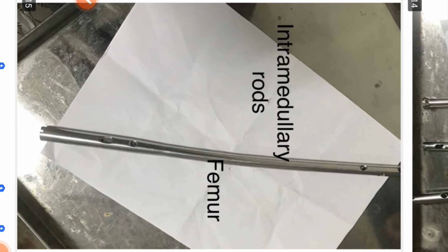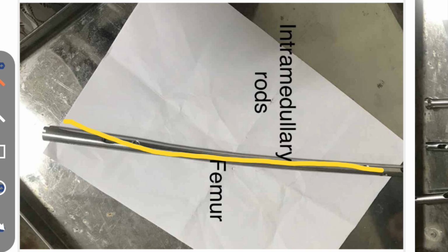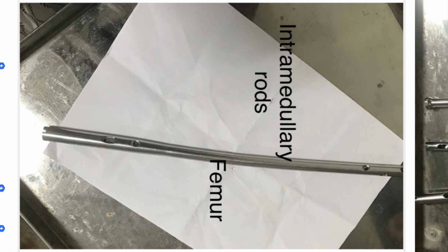So, chalo, next. This is the intramedullary rod for femur. So how is it different from intramedullary rod of tibia? You can see intramedullary rod of femur has a slight curve. Okay, it is slightly curved. This is intramedullary rod for femur.